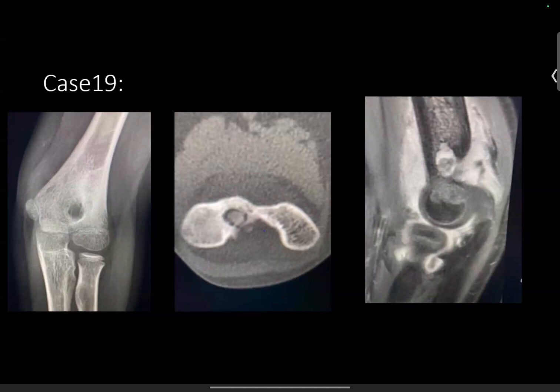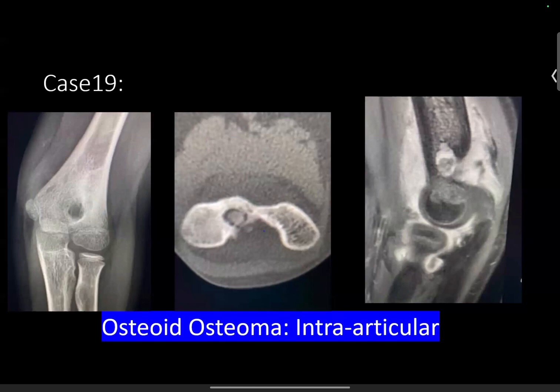And so there is a bit of a differential, yes. But this was an osteoid osteoma intra-articular. When you have osteoid osteomas that are intra-articular, they can be very troubling to diagnose because osteoid osteoma will do the same thing it does in any location, however, which is massive reaction. But when you're in the midshaft, it will cause hyperostosis, edema, periosteal reaction in the bone. When you're in the joint, it just reacts to however it knows how to react.